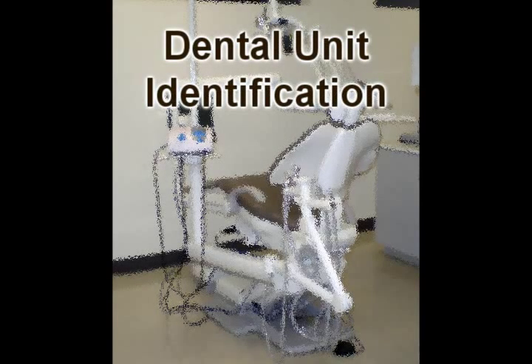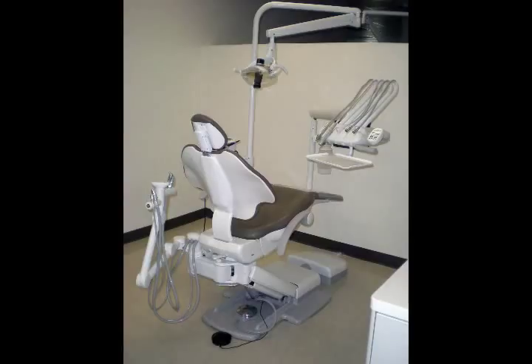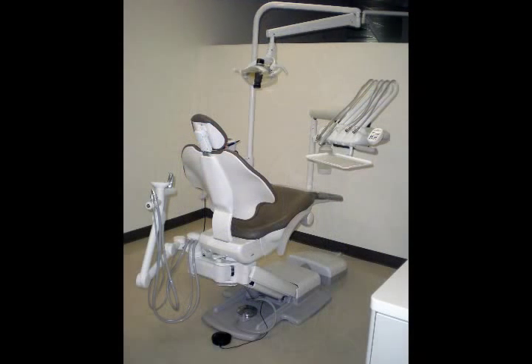This video will cover the various components of the dental chair. Areas that we will look at will include the dental chair, the continental over-the-patient delivery system, the intraoral light, the assistance arm, and the Cavitron tray. We'll now move to the right side of the dental unit.